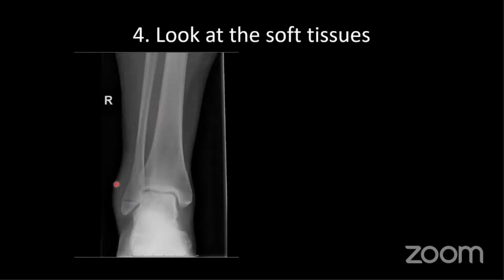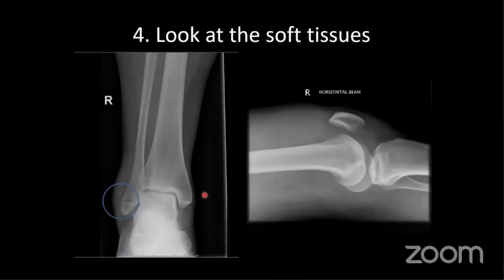This is particularly prominent in the lower limb of the ankle because most people don't have lots of fat over their malleoli, but also I'm sure Henry talked about it in his previous talk. If you look at the wrist, soft tissue swelling around the wrist is very obvious as well on X-rays. So following on from that example, what do you guys think of this X-ray?